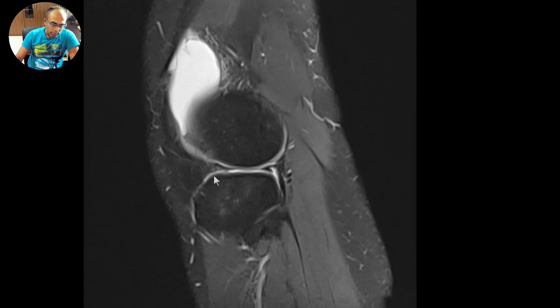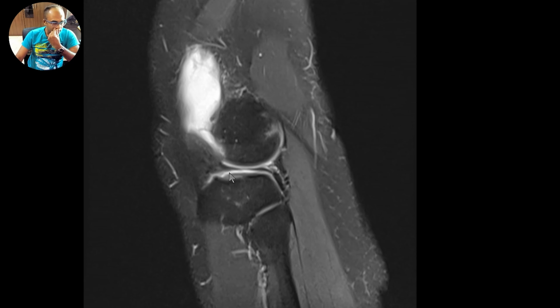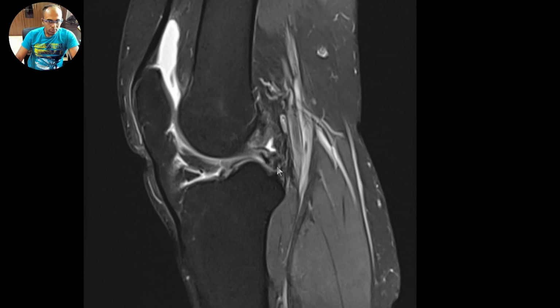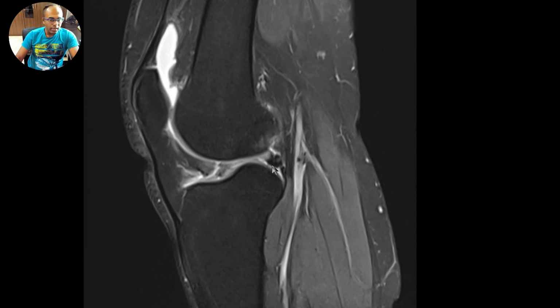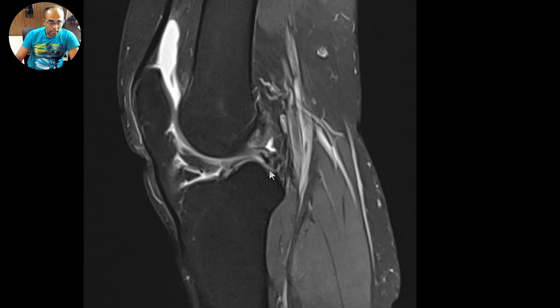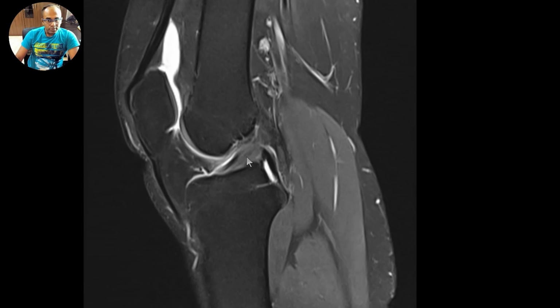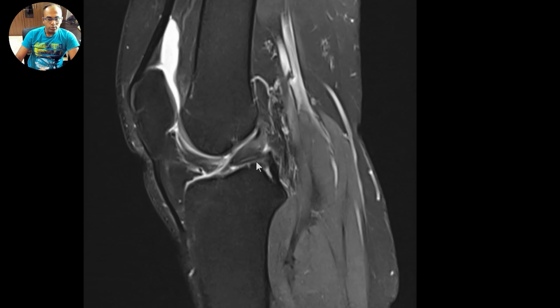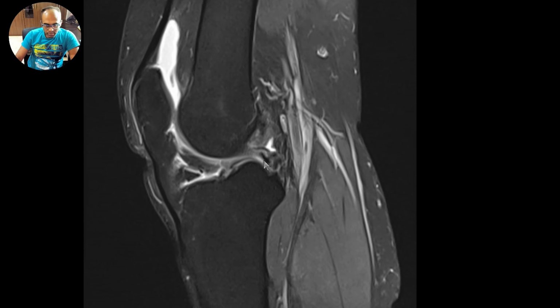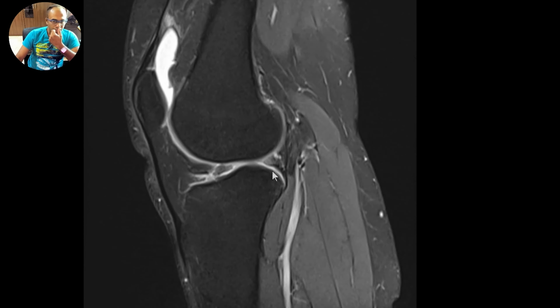How do we know it is? Because if there is a reduction in the volume of the anterior and posterior horn of the lateral meniscus and you identify an abnormal T2 signal anywhere close to the medial aspect of the meniscus, closer towards the roots, it's possible that this could be a bucket handle tear. Quite often we get the double PCL sign, where a flap is seen lying parallel to the posterior cruciate ligament, but in this case there is some meniscal fragment lying anterior to the posterior root of the lateral meniscus.